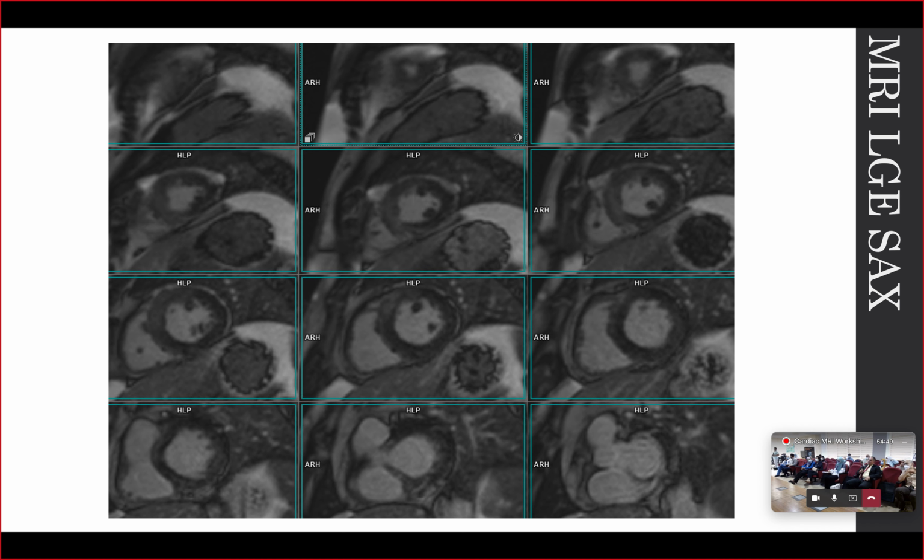But the thing is, it's atypical because it's in the basal anteroseptal part. But why was late gadolinium enhancement in this case evident, with T1 changes? Well, during Takotsubo, what happens is the edema, right? And the edema itself is either extracellular or intracellular. And if it's extracellular, this means that there is expanded extracellular space, which would give you a prolonged T1 time in the T1 maps, and will show this faint mid-wall enhancement in the late gadolinium enhancement.